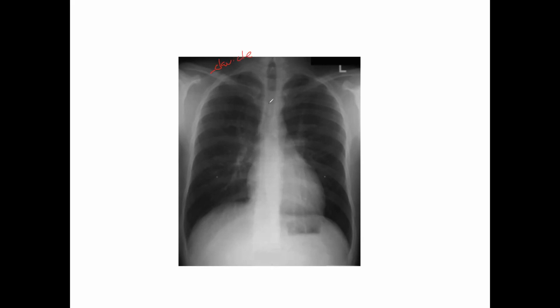Spinous processes should be seen. You can see that. So this kind of hollow tube that we see here that's more radiolucent than radiopaque, you can see the outline of that. That's your trachea. This item right here is your carina. Got your heart, a rib, costophrenic angle.